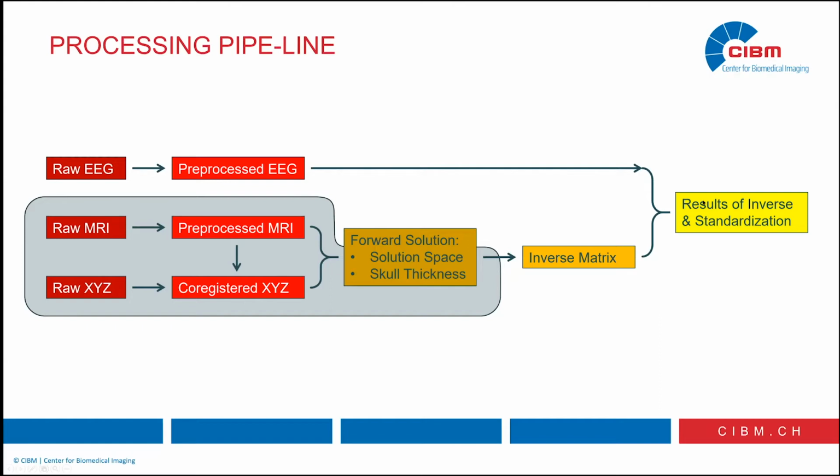Okay, so we're about to talk about EEG inverse solution. And to make it work, we have to solve what's inside this weirdly shaped box here. So basically that's resolving some geometrical problem with the MRI. I call that pre-processing the MRI in the idea of the inverse solution. How can we co-register the electrodes on this MRI? The forward solution, so the electromagnetic part, is not covered. I'm not talking about that.